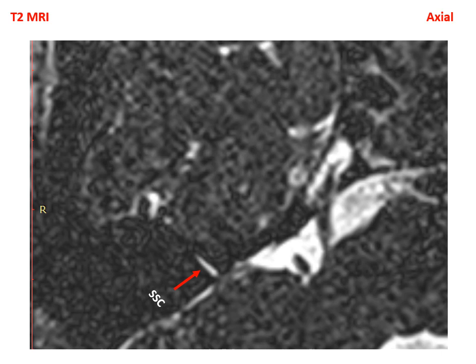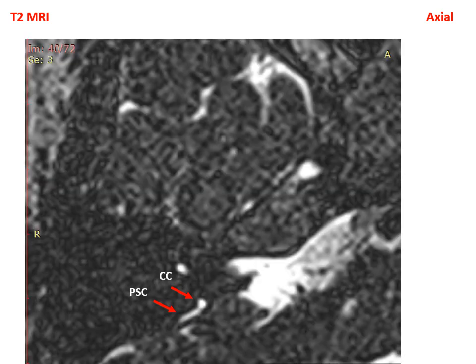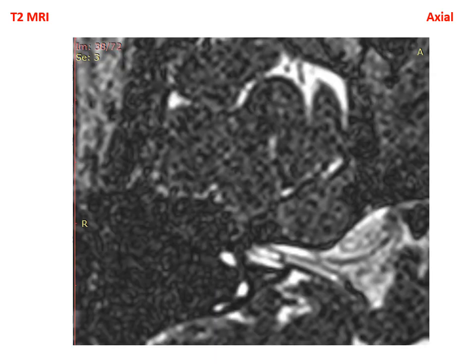Starting from superior, the first structure to look for is the superior semicircular canal, and it will look at first as a line. Going a little bit inferior, the superior canal will show as two dots. Then moving a little bit down, we'll start to look for the posterior semicircular canal and the common crus. Moving more inferior, we start to see the facial nerve and the superior vestibular nerve.